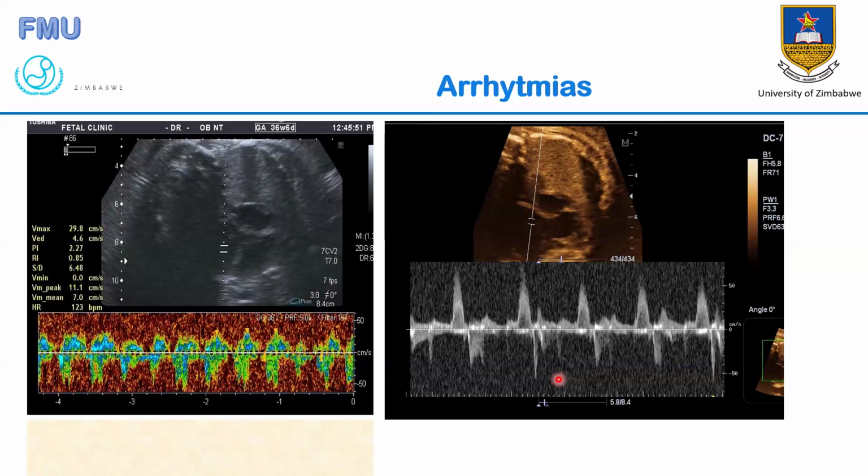Is there a sinus rhythm on this one, on the one to the left? Yes or no? Do we have a sinus rhythm on the heart in the picture to the left? Yes or no? Maybe we start with the rate. Is the rate normal? We want a yes or no. Is the heart rate normal?